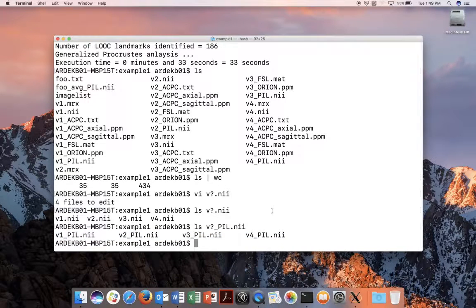In addition, the 4 images are also averaged, so the program will put out a 5th image, which is the average of these 4 images post-registration. To name the output average image, it will use the prefix that we specified.